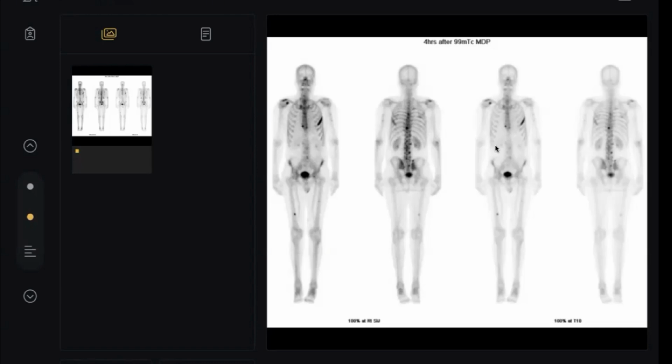Doctor, what is your next step? I will immediately convey my findings to the referring clinician and advise PSA levels and also MRI of the prostate gland for local staging. Why? Ultrasound first. We don't know. Okay, yes, ultrasound. PSA levels and ultrasound, yes.